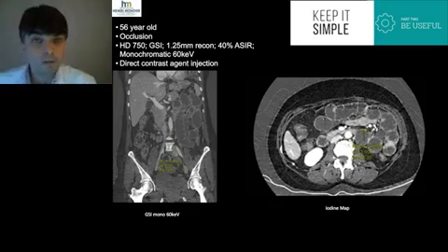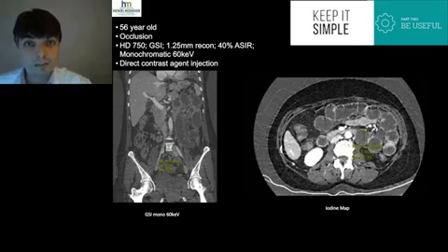If we leave oncology for a second and we are dealing with a very large clinical practice setting, which is a patient with occlusion, this is a 56-year-old patient. And I'm going to show here the advantages of doing a direct injection with spectral imaging to get rid of the non-enhanced phase. And why do you use the non-enhanced phase?